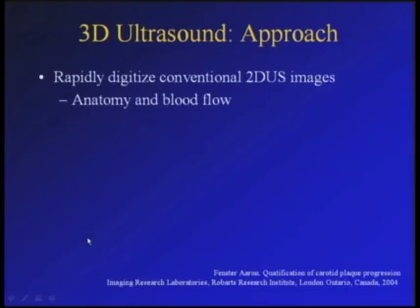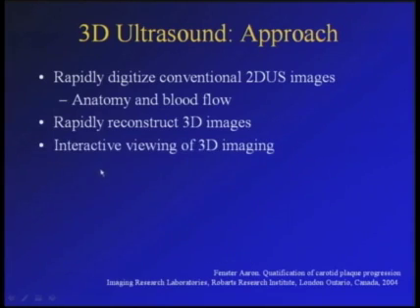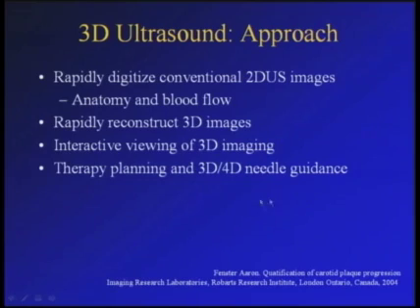The three-dimensional approach rapidly digitalizes conventional 2D ultrasound images, and not only blood flow but also the anatomy images. And 3D ultrasound rapidly reconstructs these 3D images and offers an interactive viewing of 3D imaging.